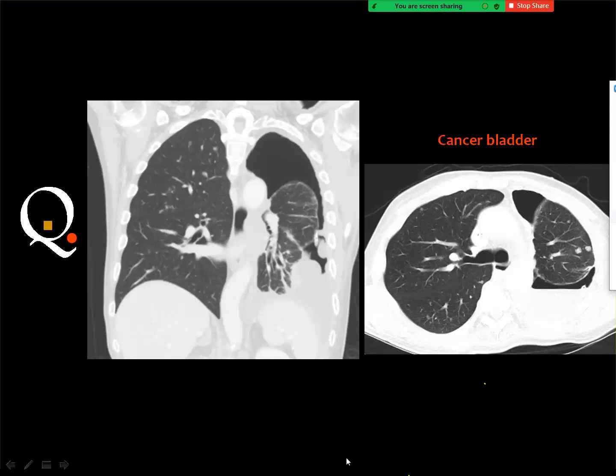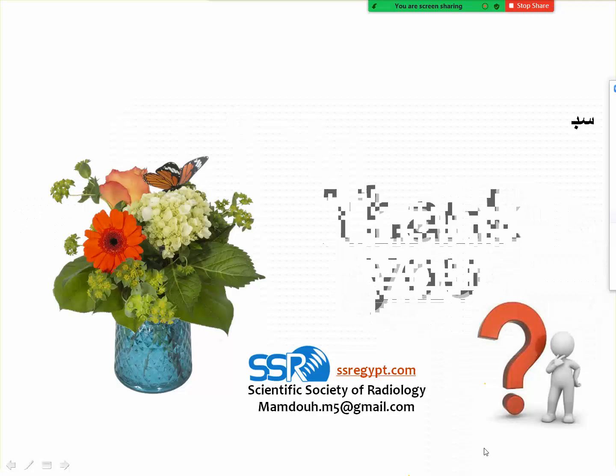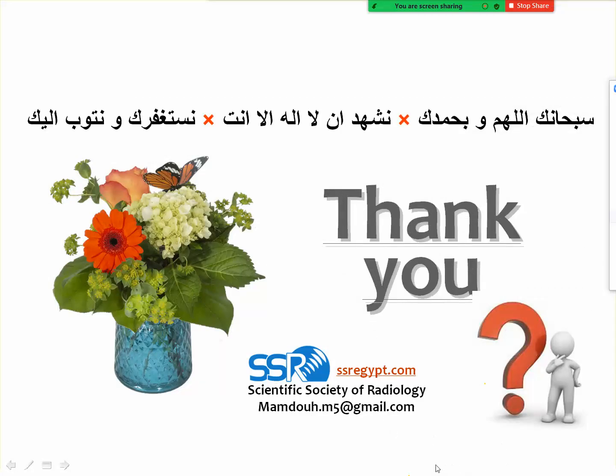Pneumothorax, no. Hydropneumothorax, yes. And Mets, yes. You got nodules in the lung. These are metastatic deposits. You got hydropneumothorax as well, and this is the right answer. Hydropneumothorax and lung metastasis. Thank you very much.